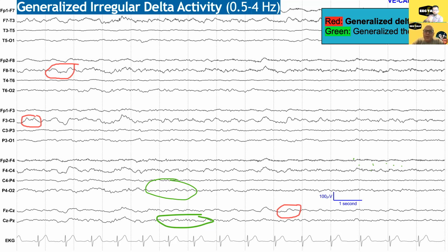That's a more severe encephalopathy, or brain dysfunction, than cases that have the combination of those. So I think we just note all the frequencies that you can discern is probably the best way to describe it.